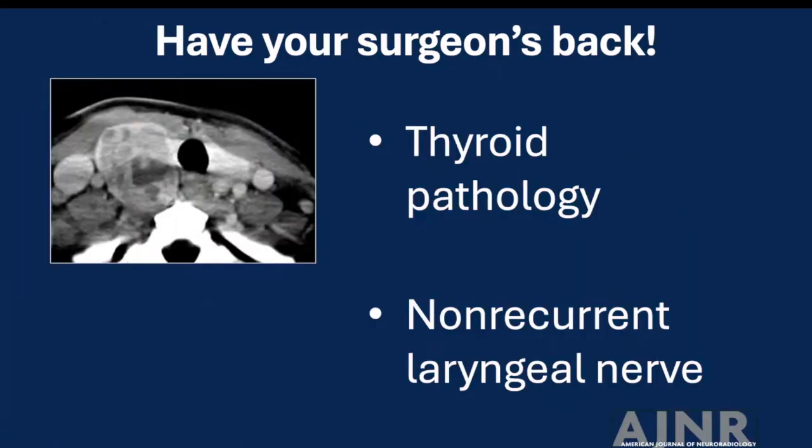So that covers what the surgeon needs to know from us to select the most appropriate operation. I want to also touch on two things we should look for to keep the surgeon, and by extension the patient and ourselves, out of trouble. No surgeon wants to perform the perfect parathyroid operation and leave a thyroid cancer behind.